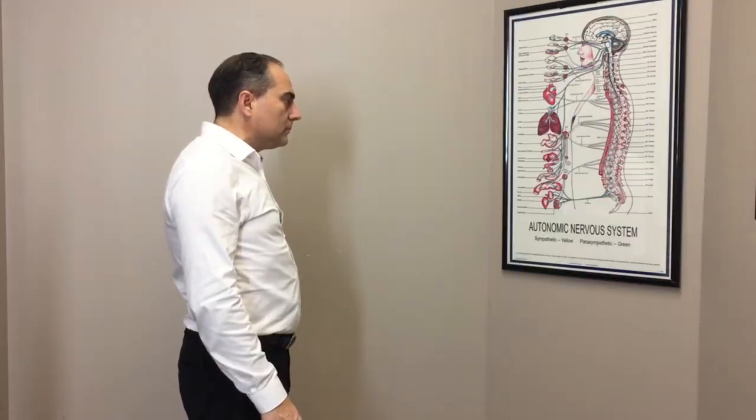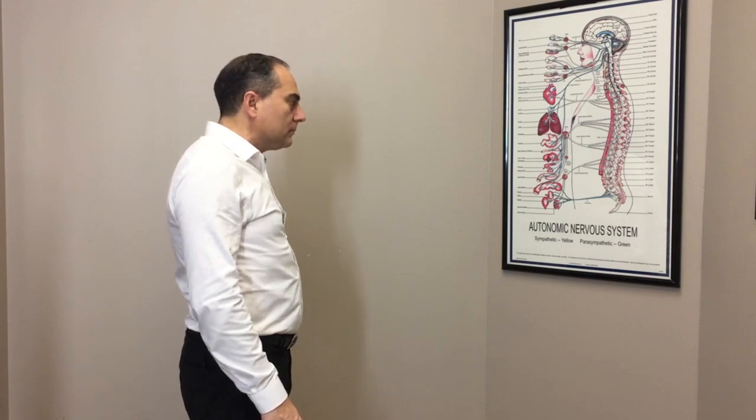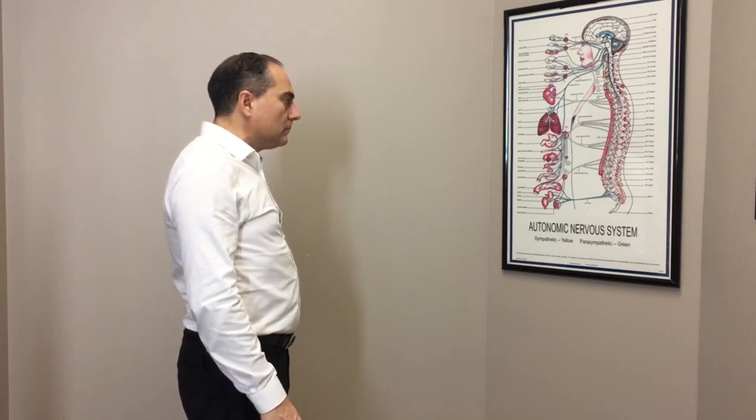The first bad posture I commonly see is a forward head position. With a forward head position, you will notice that the head is driving forward from the side view. Using the ear as a landmark, the head is forward, moving away from the shoulder. And on a spine, this is what it looks like.